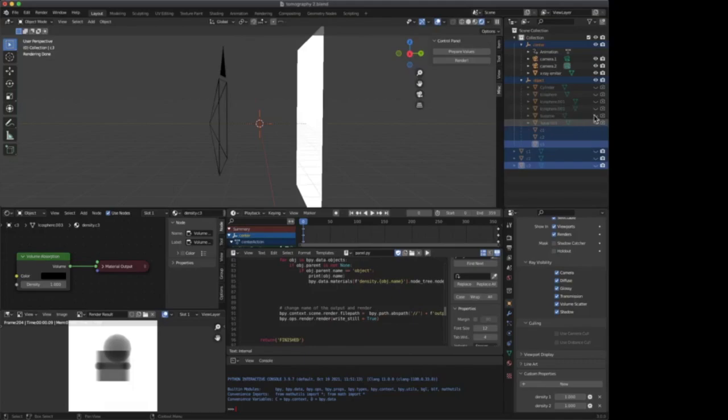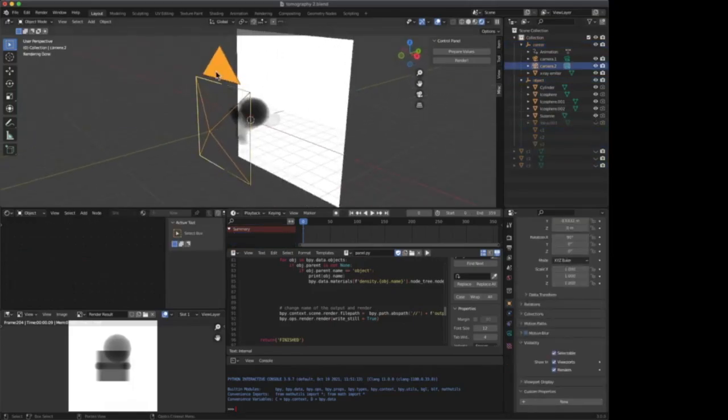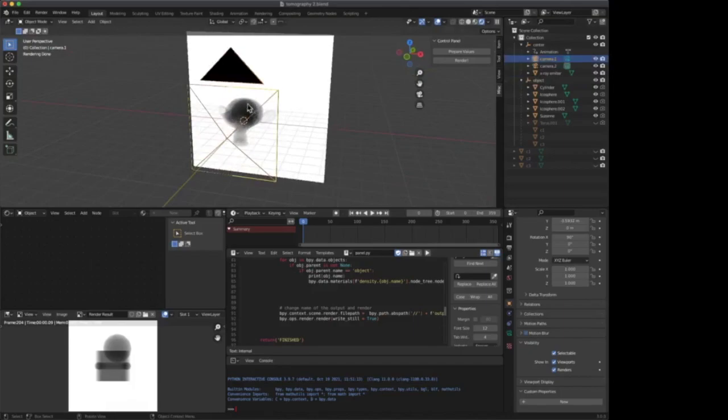In order to use the system, we draw any object in the center of the emitter and detector, and click the button in the custom interface to associate the densities for each camera. In this example, we have two cameras simulating a dual energy scan. Here we are drawing a simple monkey head with some internal structures.